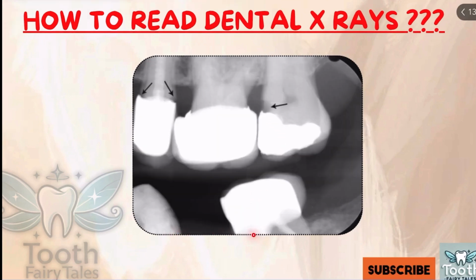The second x-ray here, again, this is a bite wing. And you can see a white structure here, which is called a filling, and a shadow here. This is a cavity underneath the filling.